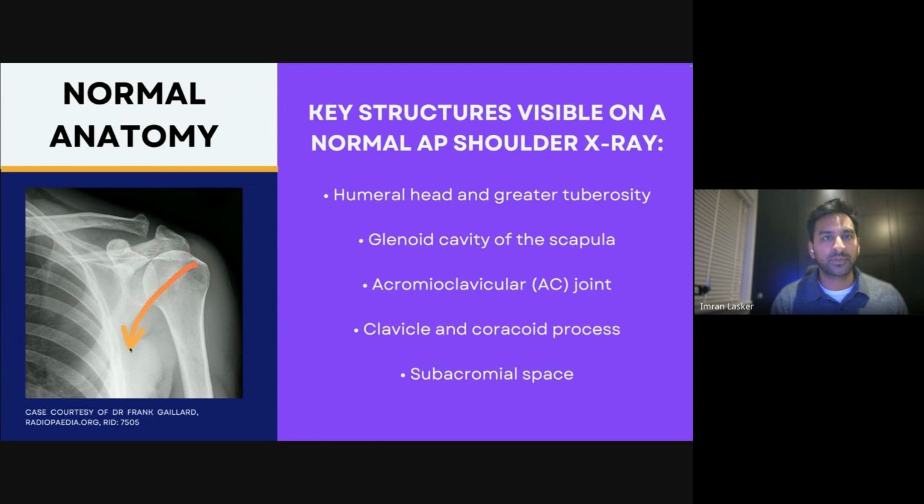Sometimes when you get proper big dislocations, if it goes anteriorly, this little edge over here hits this edge over here, and you get big fractures there and there. So both areas can get fractured. And also medial, which is towards the middle or center of the body, you've also got a bicipital groove. That's quite important when you're looking at MRI. But the greater tuberosity is a very important landmark.